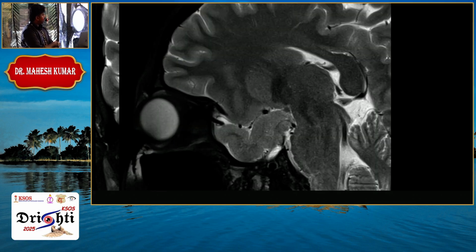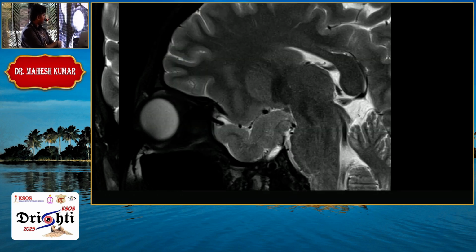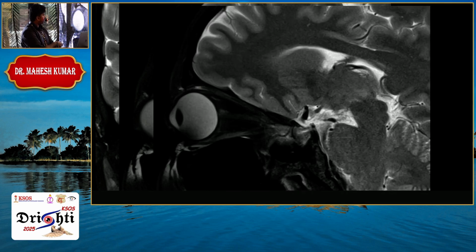And these are the sagittal images. From the sagittal images, we'll go from lateral to medial. This is the lateralmost section of the orbit, and here is the temporal lobe. Posteriorly, we have the brainstem here, and a little bit more medially, we have the orbit here, the lens here, superior rectus, inferior rectus, and the clivus region, sellar region, and the brainstem.